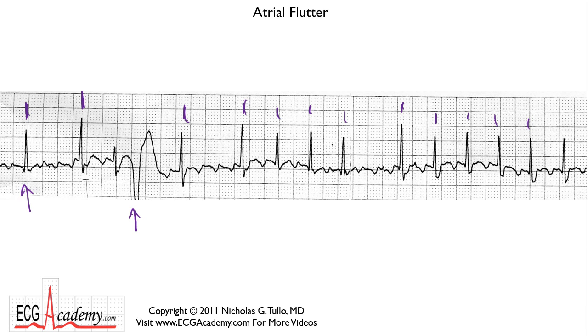So now when you start to look in between the QRS complexes, you are looking for P waves of some sort, something that you can hang your hat on. And you see a bunch of junk in here, and you don't see a discrete P wave necessarily, although you're starting to see little negative deflections here, and you wonder, could that be a P? And then in the front of this beat, there's a negative deflection here, and then in front of here, there's a negative deflection.